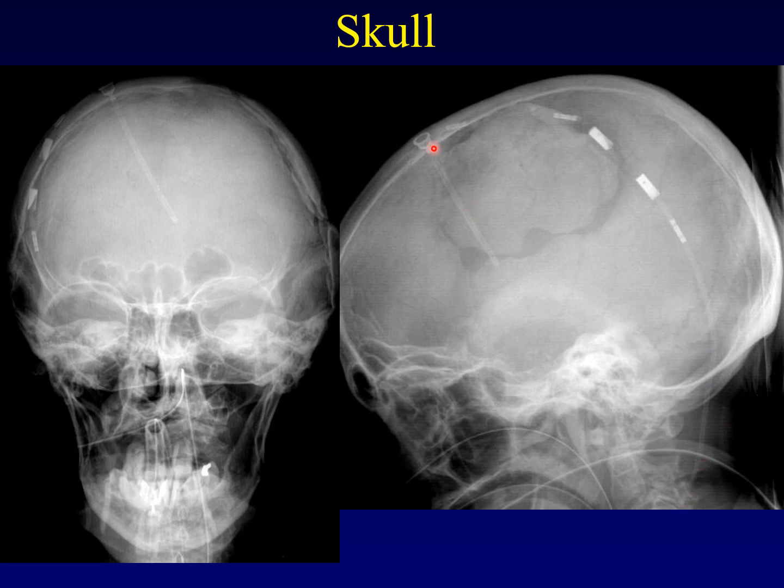Now, how do I know that this portion of the shunt is actually within the brain and not just sitting on top of the patient, because we know in conventional radiographs that it's sometimes hard to know what's in front of what. That's why I need two projections, so that I can see that in both of these projections, the shunt extends deep into the center of this skull. So it is truly in the middle of the skull. Unlike this portion of the shunt tubing, which might look like it's inside the skull on the lateral projection alone, but when you see it on the frontal projection, you can see that it's actually alongside the skull.